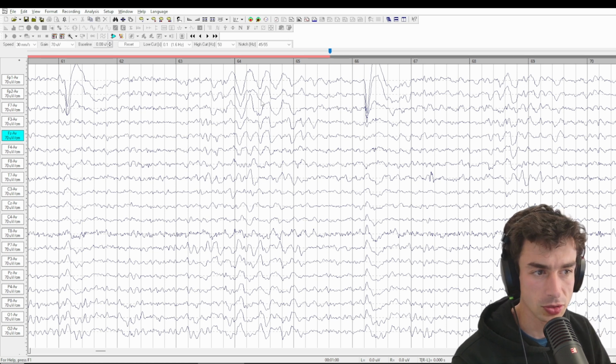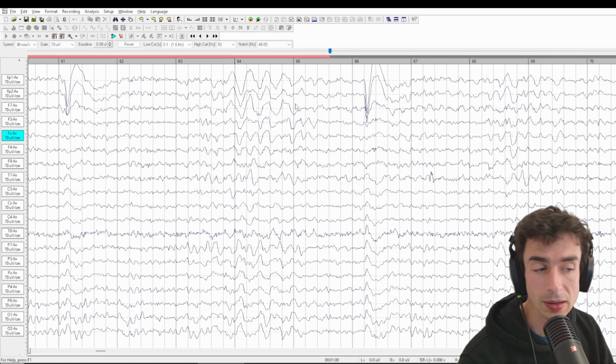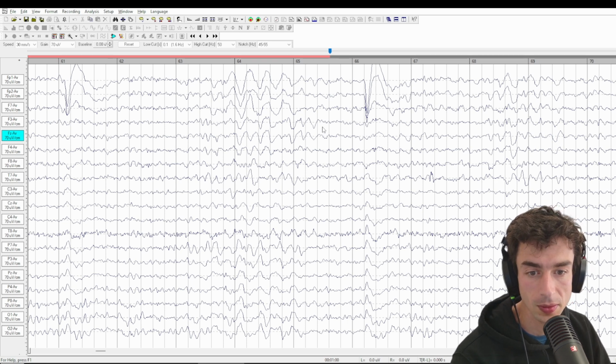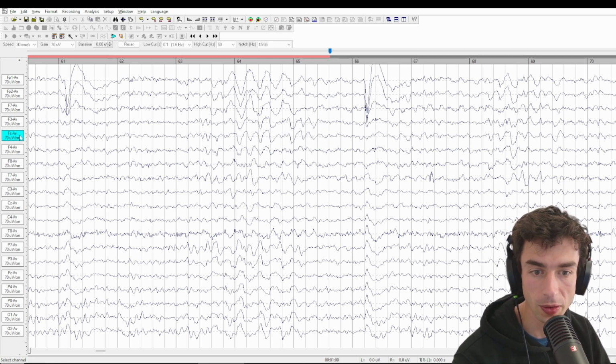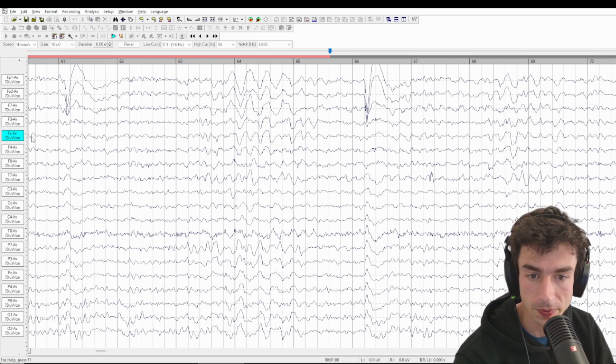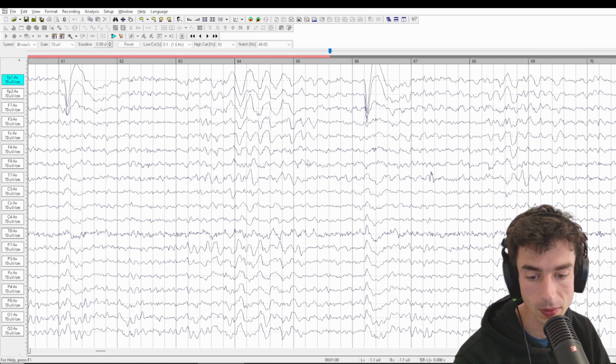And this is starting to get more interesting. This is sort of unclear here because this could be eye movement, eyelid flutter, rather, given that this is what an eye blink looks like. However, I'm inclined to think that this is more likely actual genuine frontal slowing because the topography is much more biased towards FC as opposed to just really being focused around FP1 and FP2.